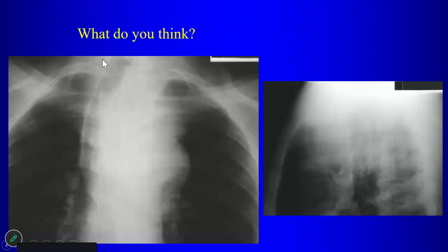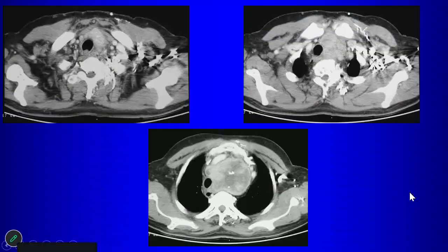Well, it's not as distinct, right? It's not as clear up here as it is down here. What do we call that? Cervicothoracic. Yeah, it's a cervicothoracic sign, which helps to point to the anterior mediastinum.